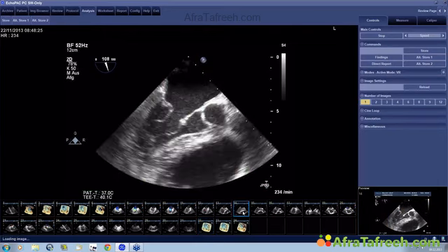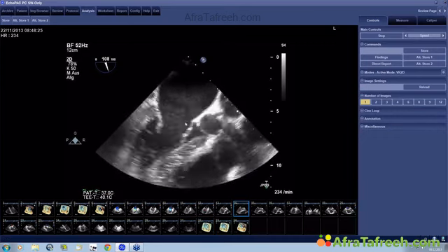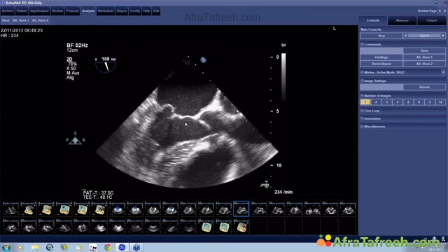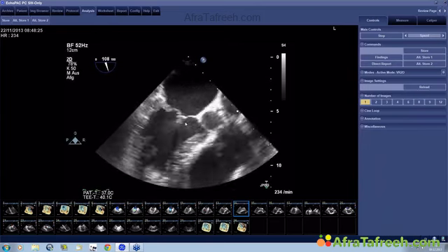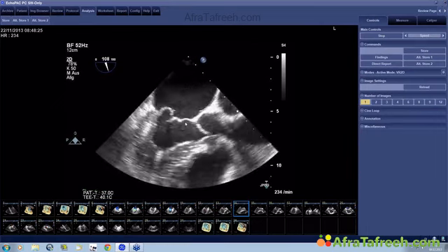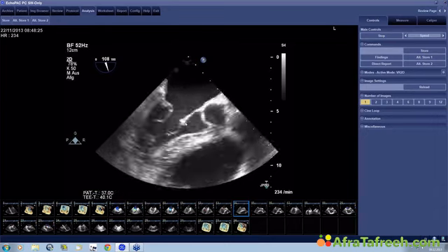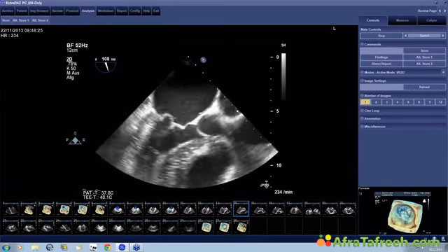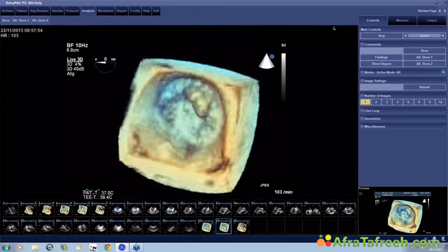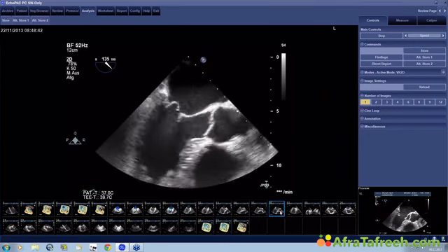So you see how many details you can actually get, but in essence, and this is maybe the key message that I want to give you, everything that is seen in 3D must also be visible in 2D, otherwise you cannot reconstruct it. So if you are very good at imaging, and very good at putting everything into a mental reconstruction, you can get a very good understanding of what is really going on. But if you want to show it to someone, for example a surgeon, or get a better understanding of the true dimensionality, 3D is certainly superior if you have good image quality. Okay, so this is just an example of what 3D can really do.